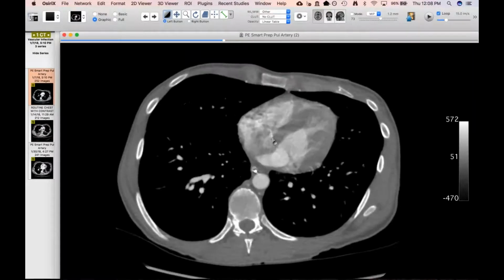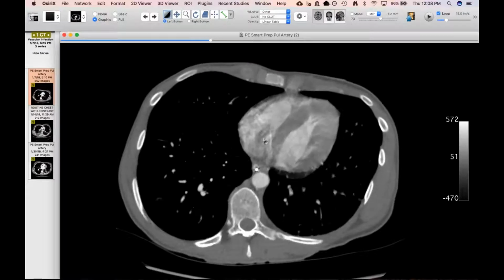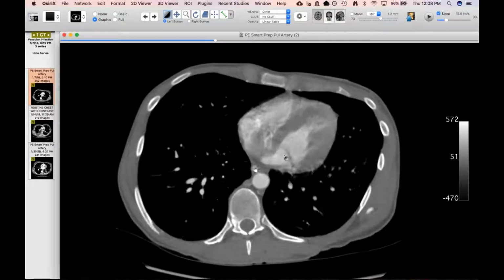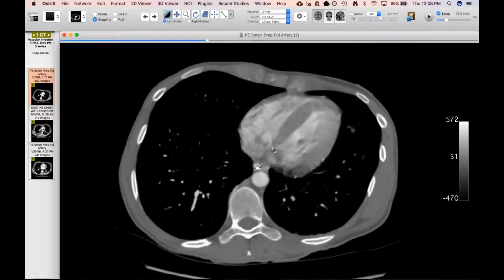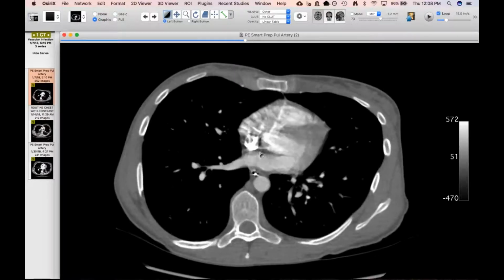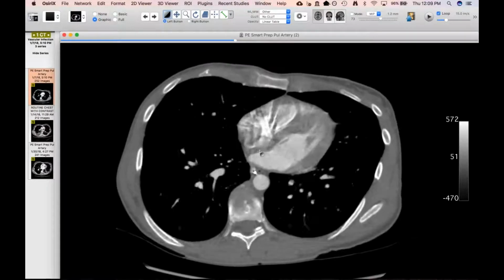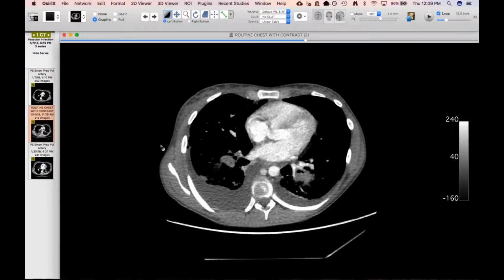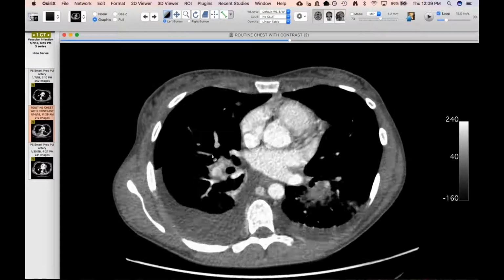And I think there was a nice observation made here, questioning whether or not there was some thickening of the tricuspid valve. And of course, there's a lot of motion here, but with the case I showed last week with the mitral valve, in this context, unless you look for subtle findings, you might not see them. But she had an echo at this time already and had a tricuspid vegetation. So I think that's what that is. And she was bacteremic with methicillin-sensitive staph. But I think what really makes this case interesting is just the evolution of the findings that she has.